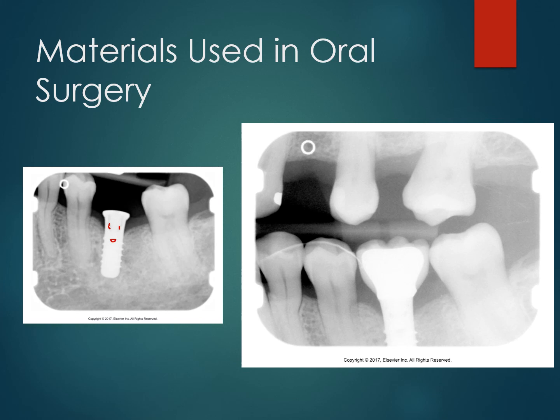And I love implants because I'm always like, look how happy your implant is, and patients, I don't know, they seem to get a kick out of it. They probably don't. They probably think I'm ridiculous.